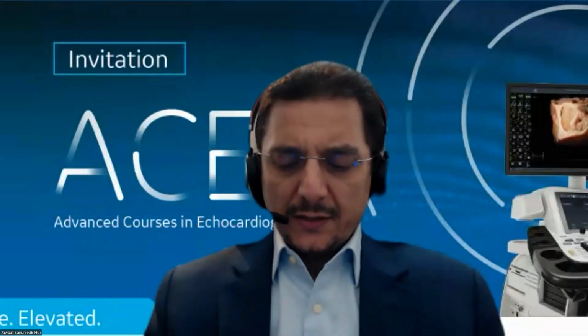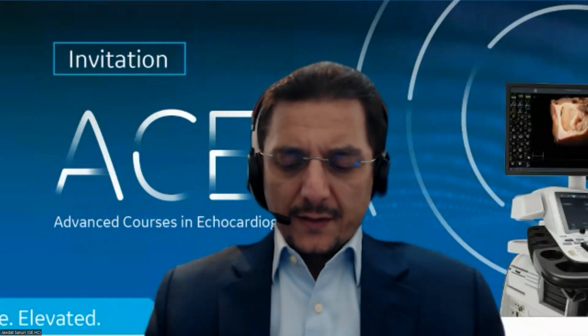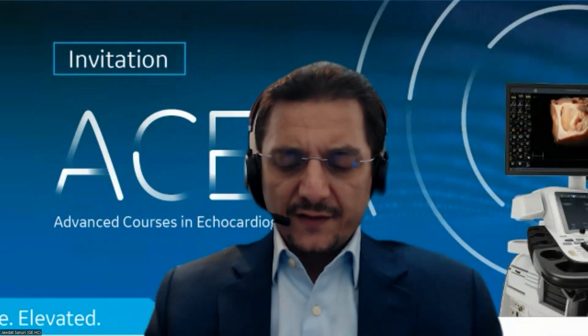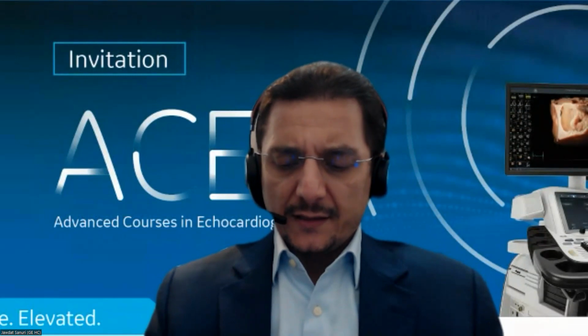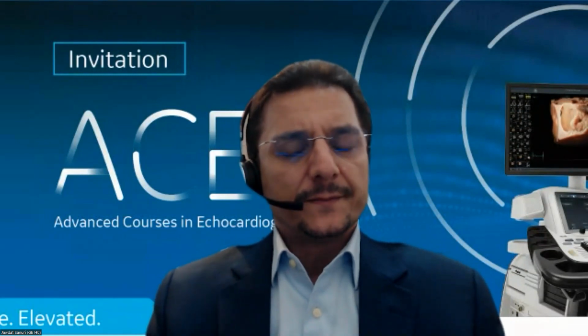Yeah, the other problem is if we are using a little contrast, maybe it's not allowed. I mean, to do any GLS with a small amount of contrast, it's not allowed, right? Not that I know of, because contrast will only give you opacification of the endocardium, unless you mean perfusion contrast of the myocardium itself, then it's too much speckle and too much information. I don't know if AFI works with contrast, to be honest, in the first place. It's not working. I tried. I don't know the mechanism, but it will not give you anything.